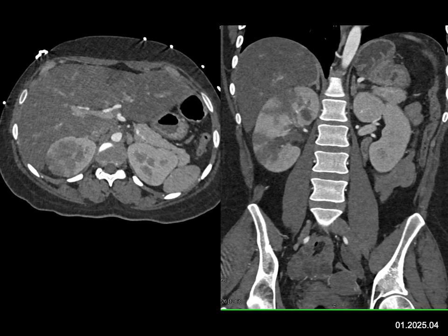The pancreas looks good in this study. Infarction we consider, but the way the low density is to the periphery, the branching of it, the enlargement of the kidney, and the history, I would favor infection. E. coli is the most common infection.